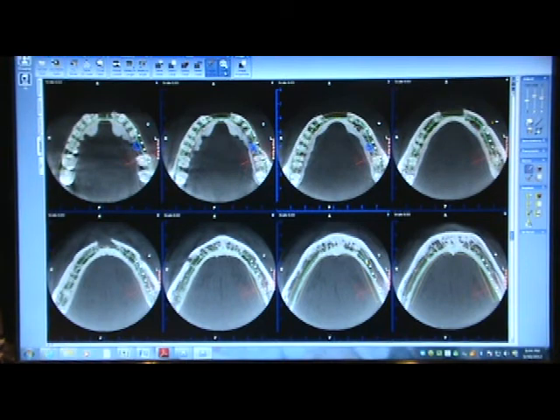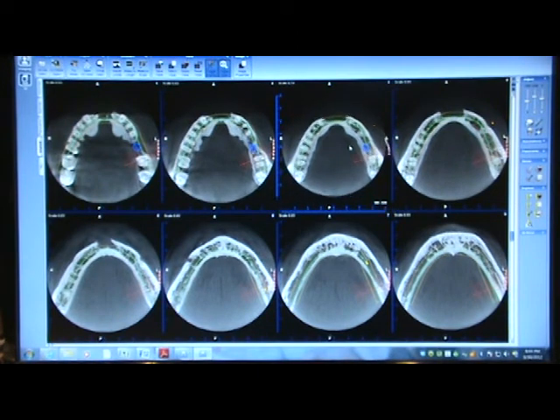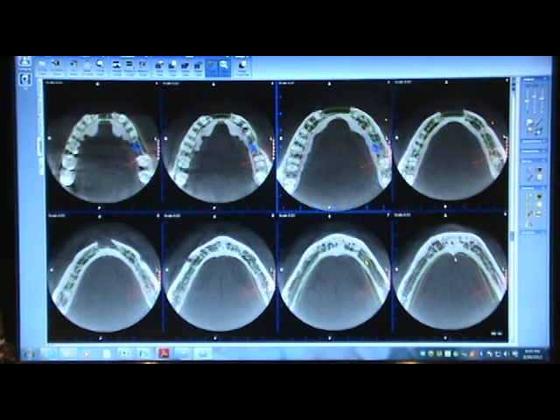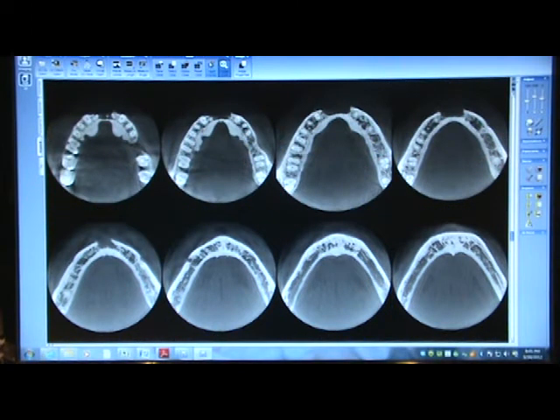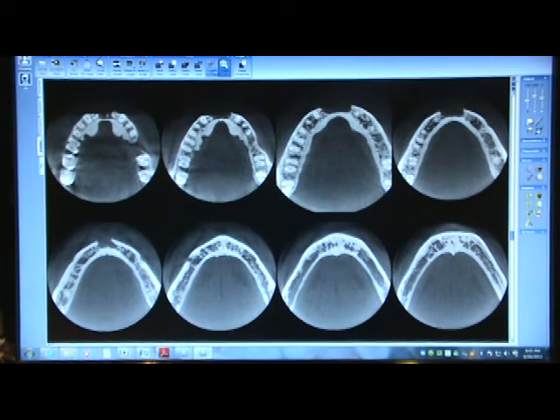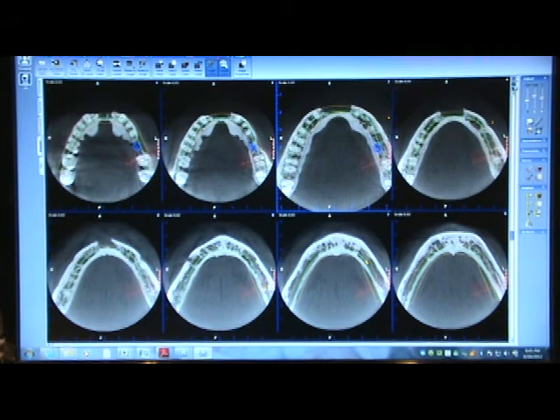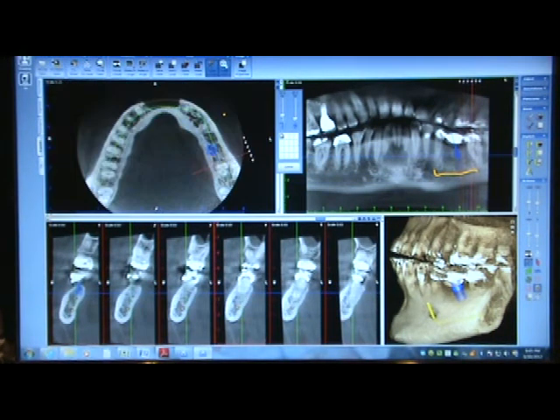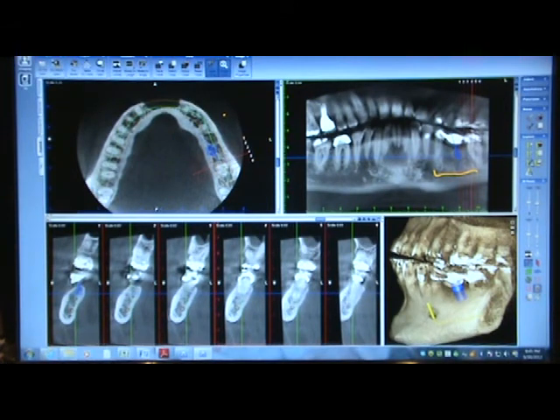Now, since the toggle zoom button is highlighted, let's get rid of this nerve. I left that up. You can toggle in and out in any window. If you want to remove some of the lines, in case they may be in your way, if you're looking at something minute, you can click that and that'll get rid of it. The toggle button, since it's highlighted, still works in and out. Toggle overlay. We can go back to here and you can hit restore, and that brings us back. You can go back to 1. Done. Now over here, what we'll do is we'll go back to our Explorer.